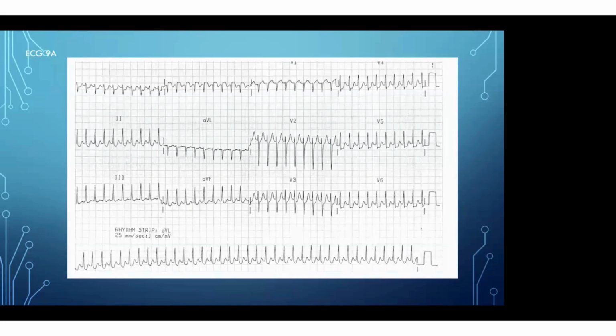Very high heart rate. It's not in the physiological range. So it's a pathological tachycardia, narrow QRS. Are you seeing any P wave or PR relation or anything like that? No P wave seen. Okay. Then this is an SVT.